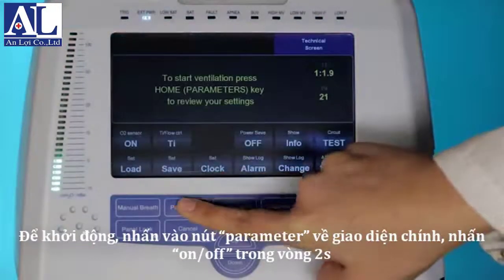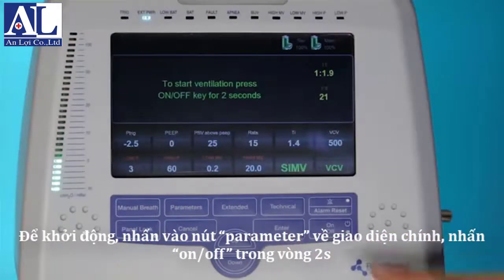To begin ventilation, enter the Parameters screen and press the On-Off button for 2 seconds.